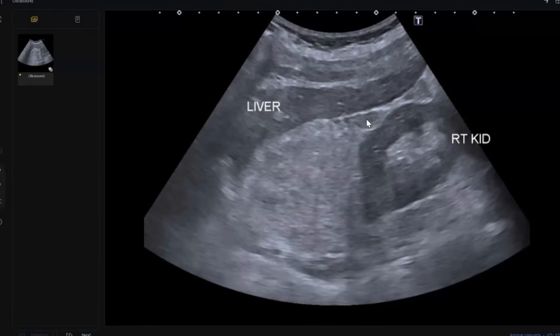There was vascularity on the Doppler study, since it's very echogenic, and that's a feature of a fatty component, but there was also associated vascularity in it. So I am thinking that it might be a mixed density adenoma. For the second differential it can be a metastatic lesion, for which I would like to correlate with the history of any known malignancy of the patient.